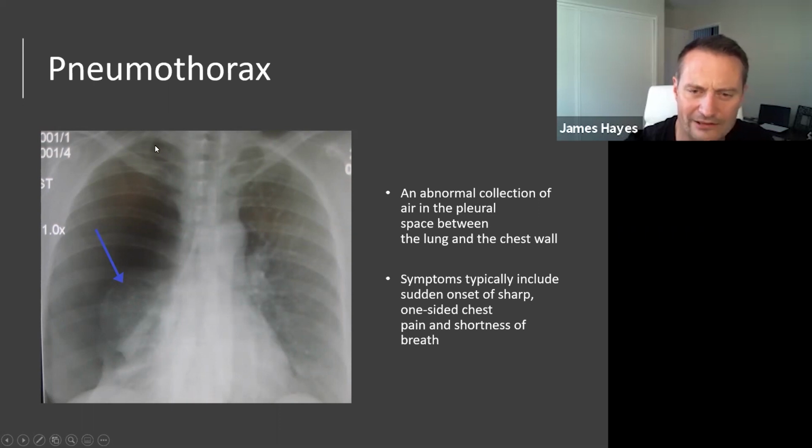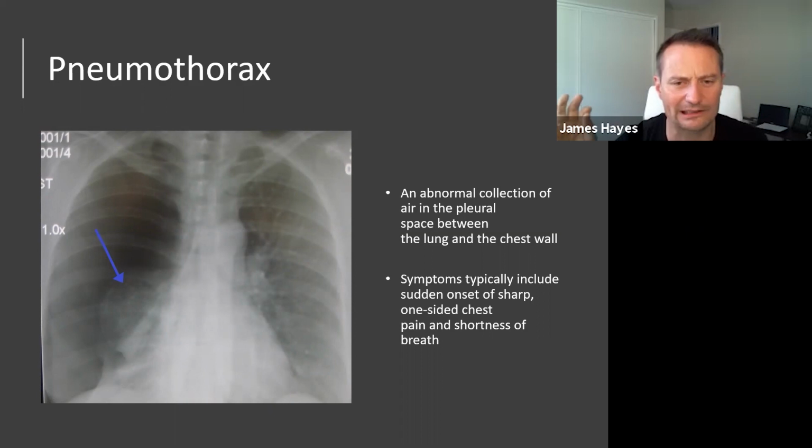Now, if that's the case, this entire lung cavity looks the same density. So unless you're really comparing it, which you should be, because you've learnt the rule of 2, to the other side, you're like, yep, this lung looks right. And then you go over to here and you say, this lung looks right, but it's not even a lung, it's just a hole, okay? But you don't notice that because the whole density is the same. So the little ones are hard to see and the really big ones are hard to see, but everything else looks quite easy because it's black hole next to normal-ish lung.